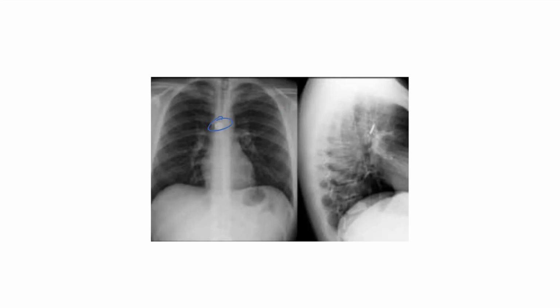This X-ray shows foreign body in trachea.